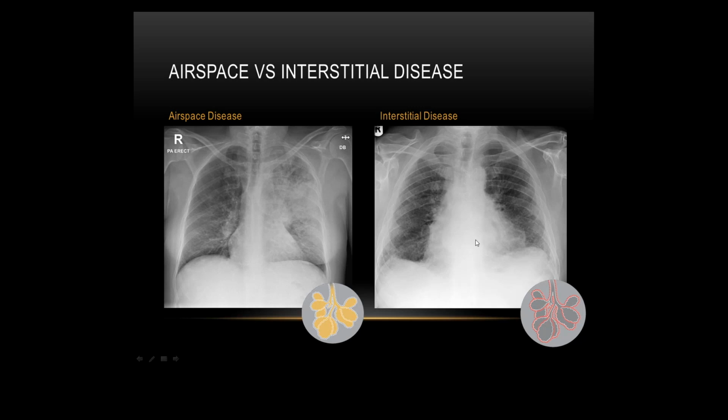I've got a better case of it later on. It's quite small though, so you can't really appreciate them, but there's sort of some here. But I have got a better case of it later on that's blown up as well.